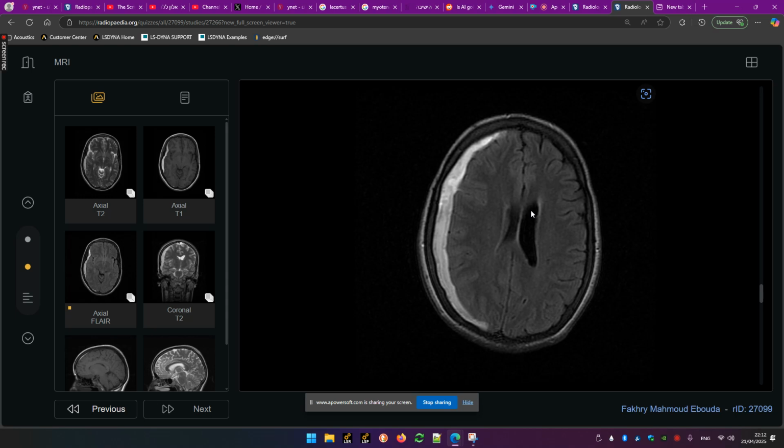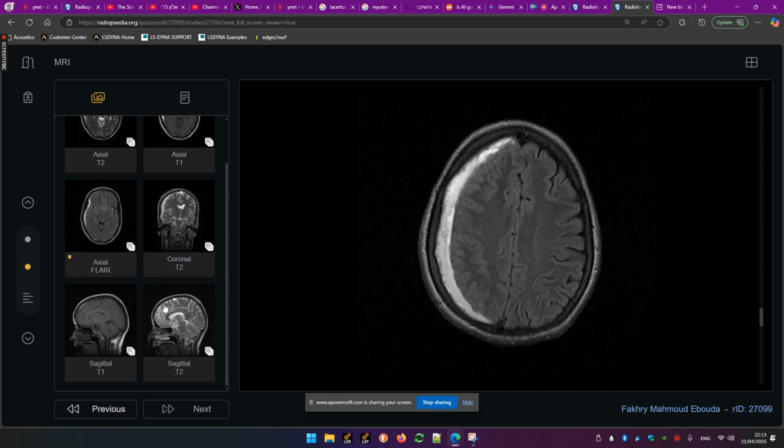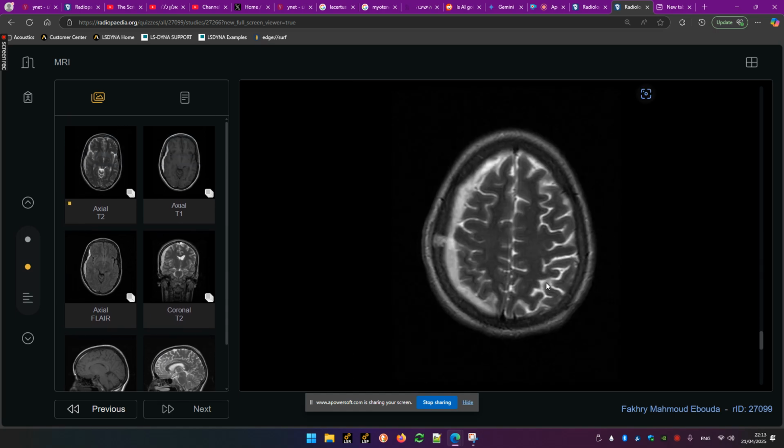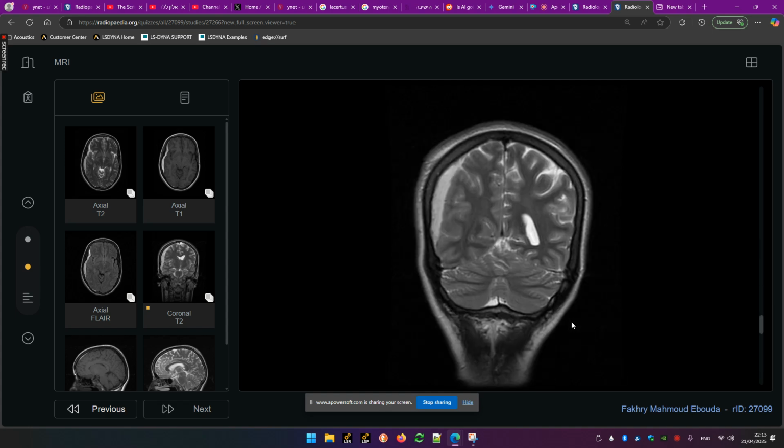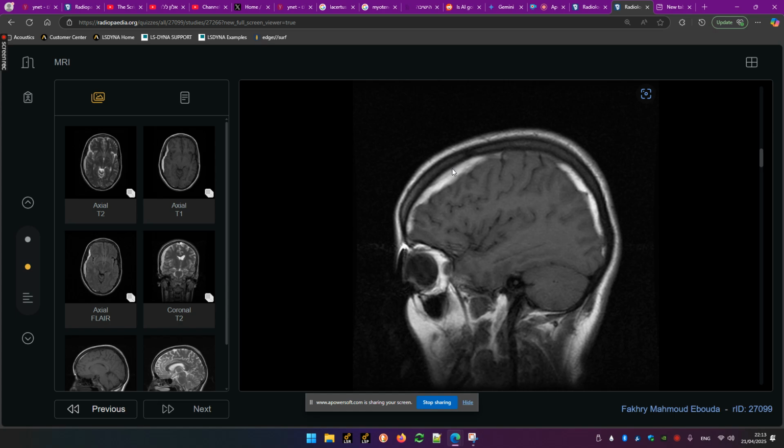This is maybe the most likely diagnosis, I think. And there is no SOL, space occupying lesion, that I thought. So we are talking about subdural, yeah? I don't see any other differential to think about, not too much, of course. And there is no MRV, so I think what I saw was part of this subdural. Yes, this is what I saw.